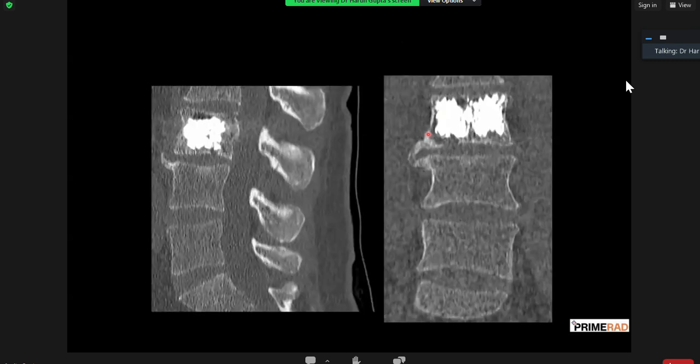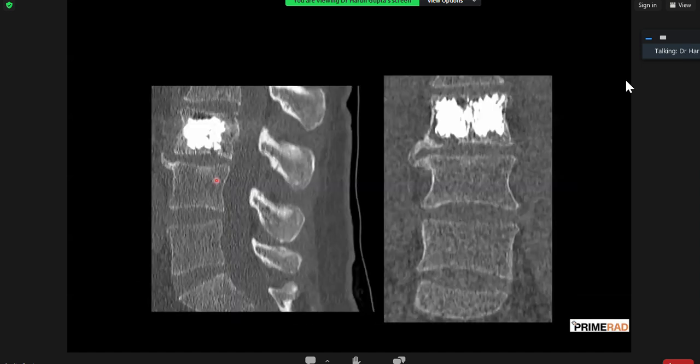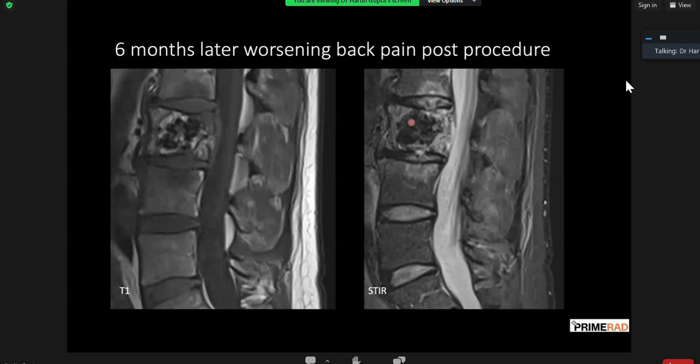The CT scan showed this syndesmophyte, which is fusing all over. And at the very edge of the imaging, we saw erosive changes at the sacroiliac joint. So overall, all these changes are because of aseptic spondylodiscitis, not septic spondylodiscitis.